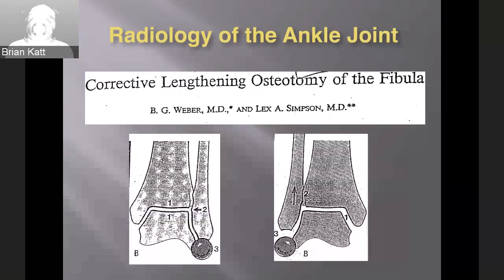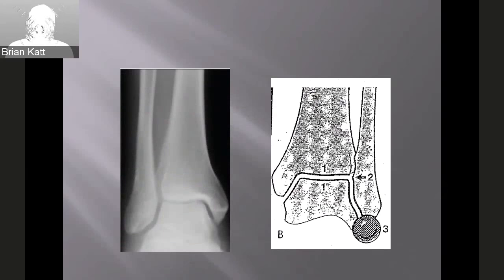In terms of the radiology of the ankle, I'm sure everyone's familiar with the basic X-ray structures, but we'll talk all the time when we're fixing these fractures, especially these comminuted fibular fractures, about whether we are getting the fibula out to length. And really what we're describing with that is we want to see a parallel tibial and talar dome.